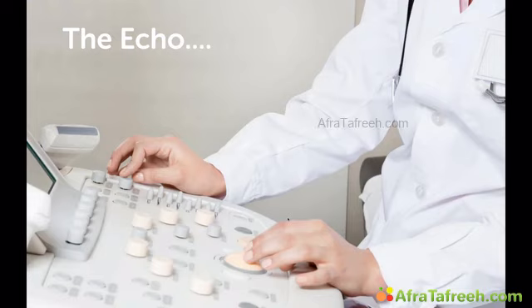First of all, it's difficult to do. In selected patients, it might work, and you can determine if the synchrony is there. But I think the value of TDI is just not very high. I know there are other people who think differently, but the community has turned away from TDI and is not performing it anymore because it's a waste of time.